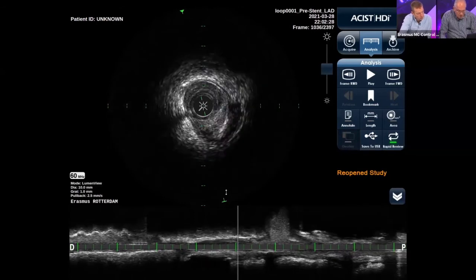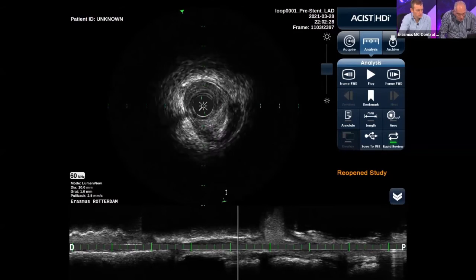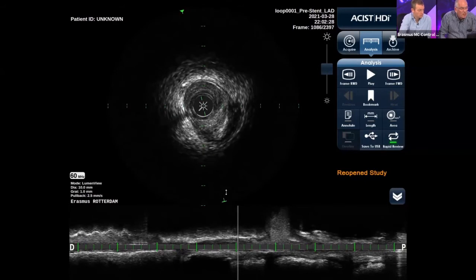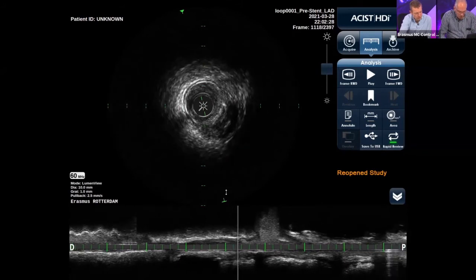Yeah. So Jurgen, is this thrombus or calcium? Now I think it's a combination. I think that there's calcium. That we see some deep calcium. We may see some thrombus in there, and it can also be a part of, but that's a bit difficult to see here. I would say that we appreciate more subacute thrombus in combination, indeed, with some calcified plaque in there. Exactly. So no organized thrombus in this case. In this case, no. Subacute. So we hope you already start to appreciate that.